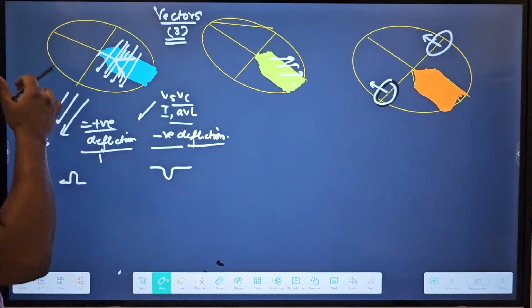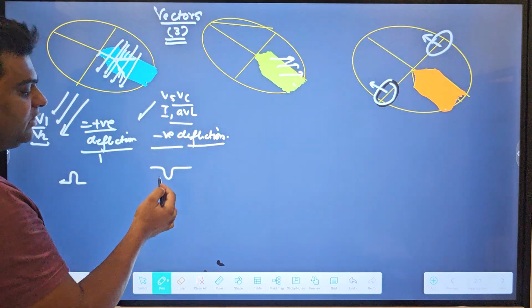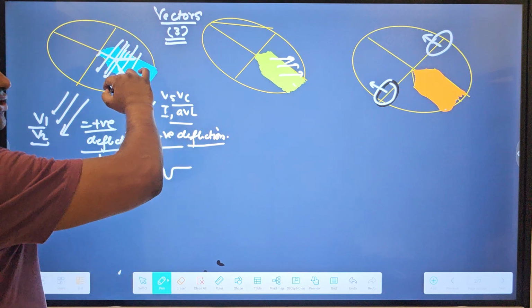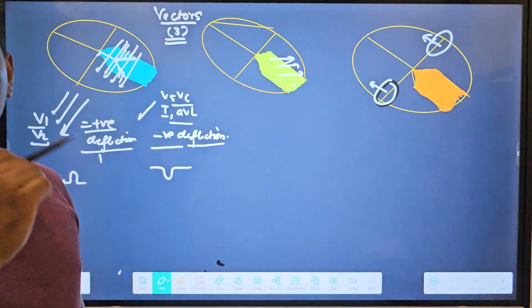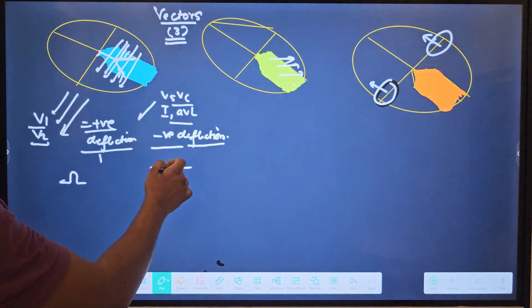That's why I have told you that normally in leads V5, V6, 1 and AVL, you get a Q wave. And in left bundle branch block, when the septal depolarization direction changes from right to left, this Q wave is lost, and thus loss of Q wave is one of the criteria for diagnosis of left bundle branch block. So this is because of the septal depolarization.